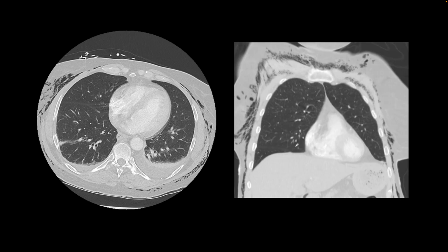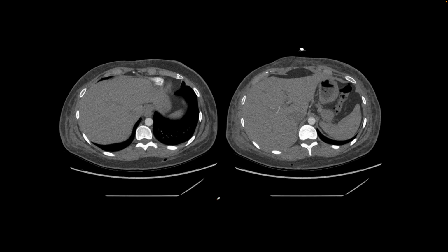Here's our next patient. They had an abdominal laparoscopic surgery, and after surgery they developed extensive emphysematous changes involving the chest wall, and they presented to the ER, and a CTPE study was performed. And so in this lung window, which is very useful for looking at pneumomediastinum or chest wall emphysema, we find extensive chest wall emphysema from prior abdominal surgery.